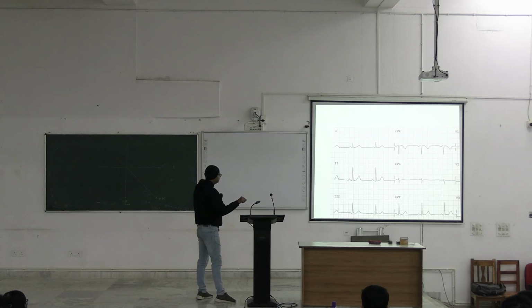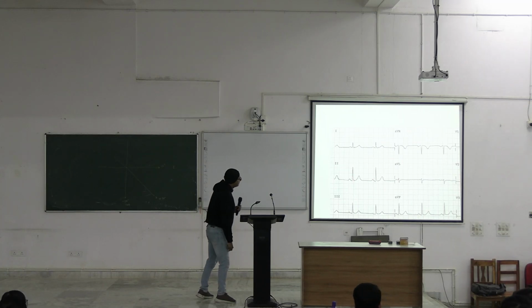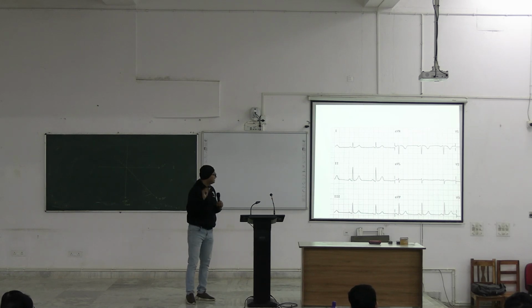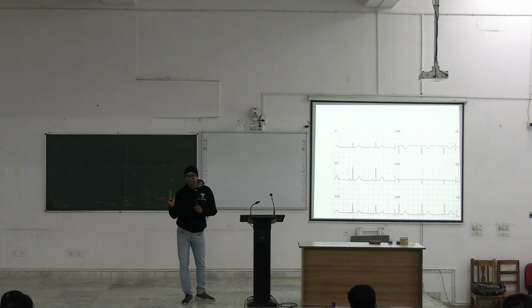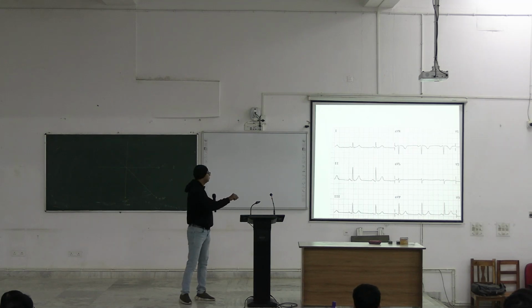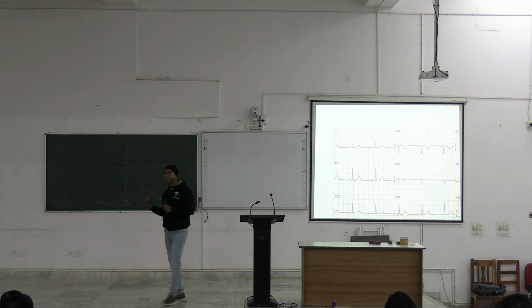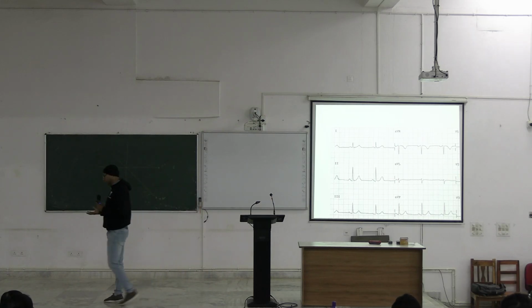Can you see here in lead 2 there is a slight negative deflection as well. That is Q, right. Q is minus 1.